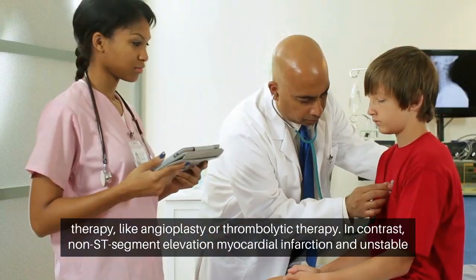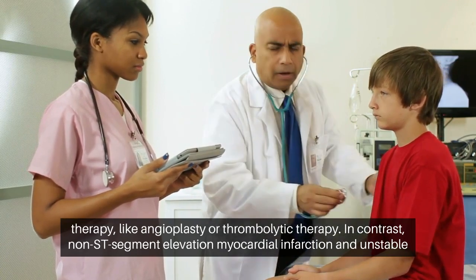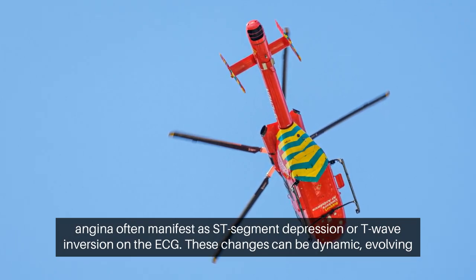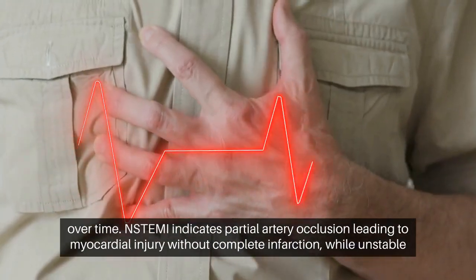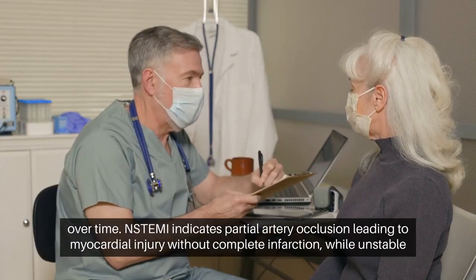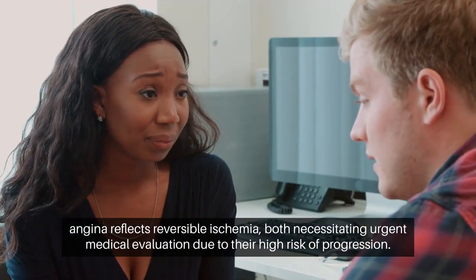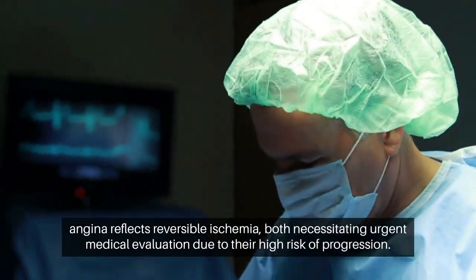In contrast, non-ST segment elevation myocardial infarction and unstable angina often manifest as ST segment depression or T-wave inversion on the ECG. These changes can be dynamic, evolving over time. NSTEMI indicates partial artery occlusion leading to myocardial injury without complete infarction, while unstable angina reflects reversible ischemia, both necessitating urgent medical evaluation due to their high risk of progression.